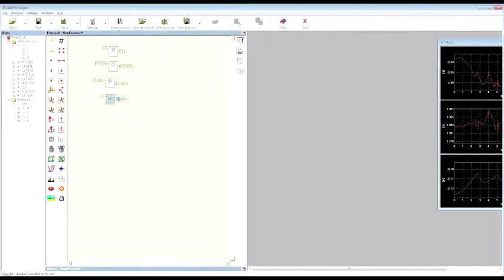I can do the same for the lateral elbow. And the same for the medial. So as you can see, you can just copy one operator and paste it. And what you have to do after that is to rename the output.